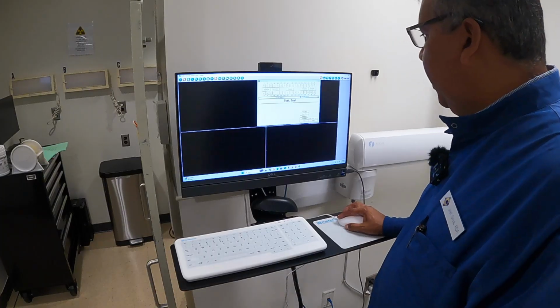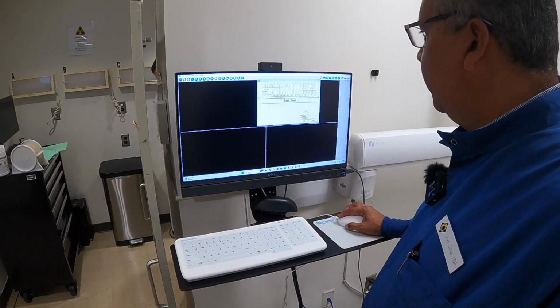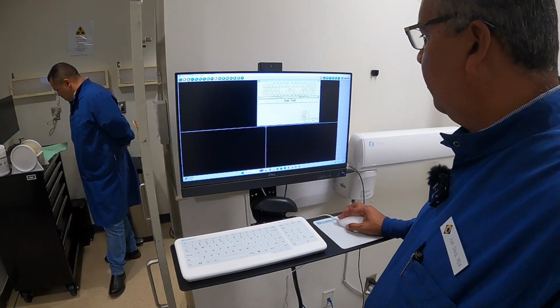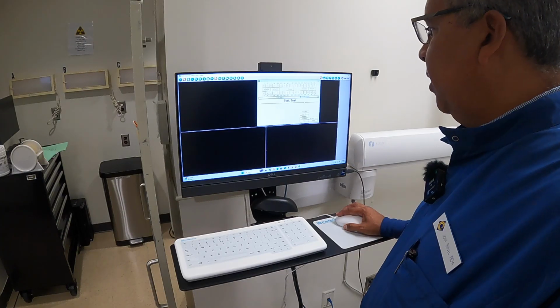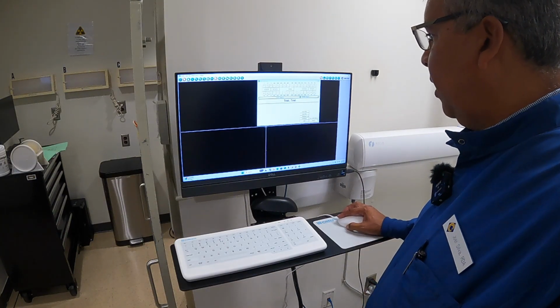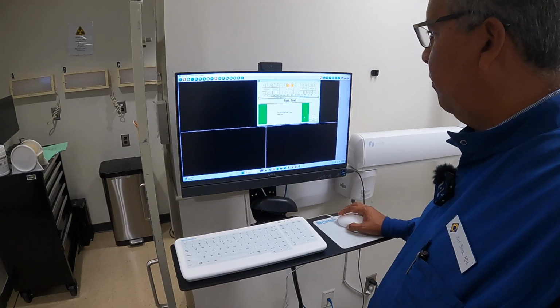And we are going to take, and this is really important too because it really shows what it is we're going to be taking. If you click on any one of these other ones for some x-rays, it's going to show up in a different way. This one is pedo, but we're not doing pedo. Vertical bite wings, we're not going to do that yet, but we are doing bite wings. So we're going to go ahead and press on bite wings.